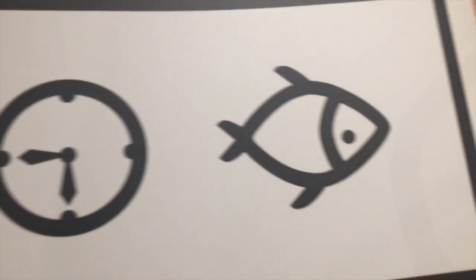So again, you see 30, but when it was the house and the van the last time, this time we've got the clock and the fish. So there are two tests in the one booklet, so please be aware of that. But the easiest rule of thumb is remember to look at the side that's facing you, top left corner, and it will tell you what the result is, what the acuity is in logMAR.